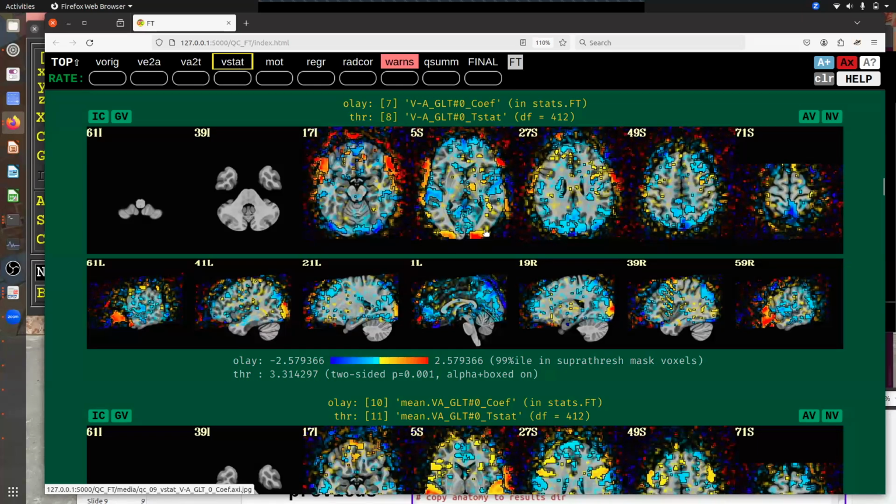And here in the main part of the visual cortex is still hot color, because the visual response is much bigger. All of these other parts, certainly up here by the ventricles or in white matter, are probably noise that won't survive group statistics. This part, let's say here, I'm not exactly sure why that is.